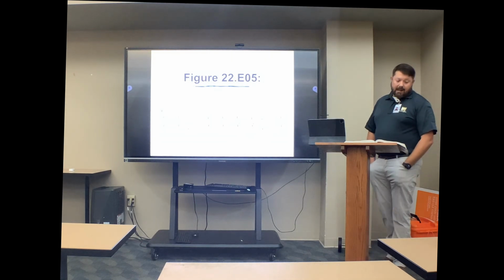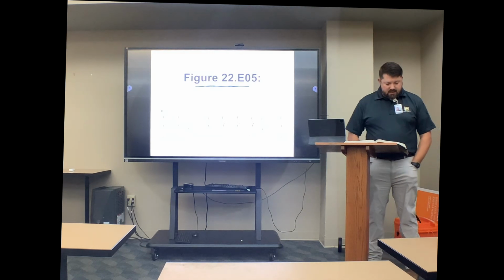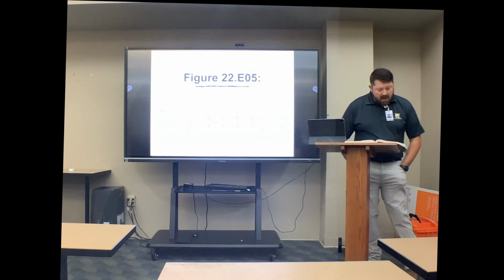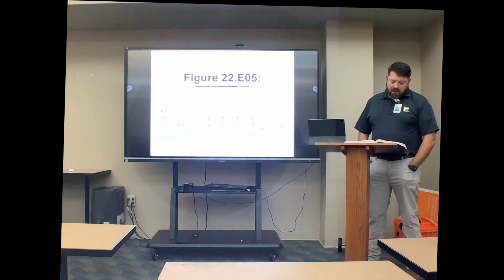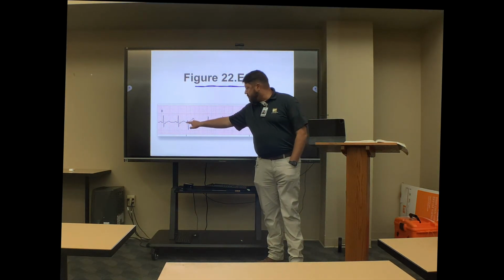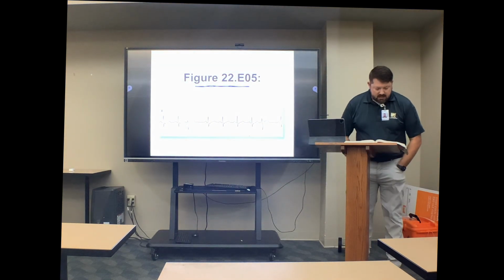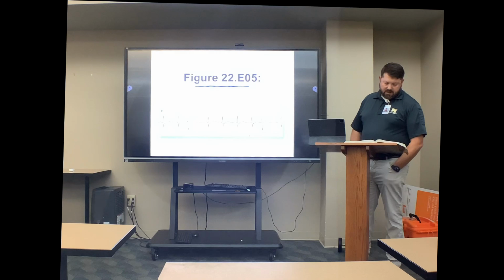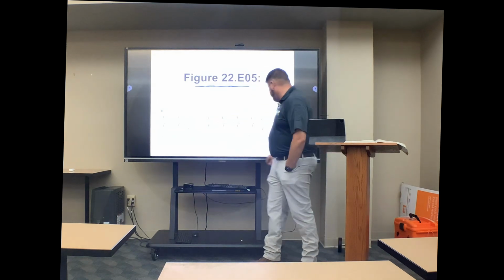So on this one, once again, we're faced with a diagnostic challenge. Are the wide premature complexes on this junctional or ventricular origin? How do both aberrant beats start? They start with positive waves that are identical to the start of the sinus QRS complexes. Even though it's tiny, that is still a positive R wave. Then an aberrancy begins to develop along a slightly different location for each one, accounting for the slight differences in morphology between the two. Look, there and there.